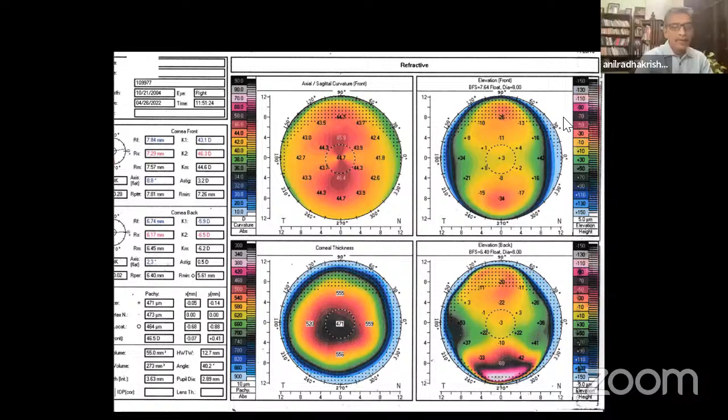Okay. 0.88 is slightly suspicious. It's more than 0.5. Y coordinate is slightly deviant. Not too much, but still. Up to 1, will we take it as normal? Yeah. More than 1 only, you can take it as pathological. But anything more than like 0.5, you should be suspicious.